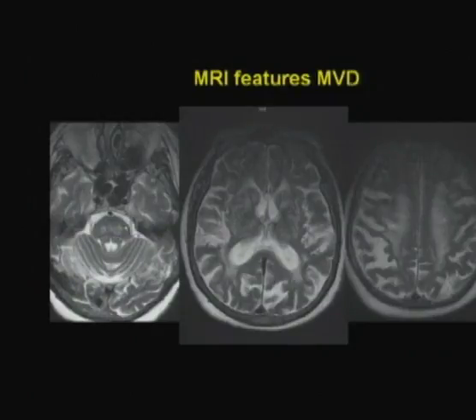About the only kind of involvement you see is patchy changes in the brainstem at the level of the pons, and that's about it. Demyelinating disease from things like multiple sclerosis loves the brainstem, loves the cerebellar peduncles, the cerebellum. Not so for microvascular disease. Also, demyelinating disease due to multiple sclerosis and other inflammatory conditions loves the corpus callosum, loves the arcuate fibers. All these areas are not involved by microvascular disease.